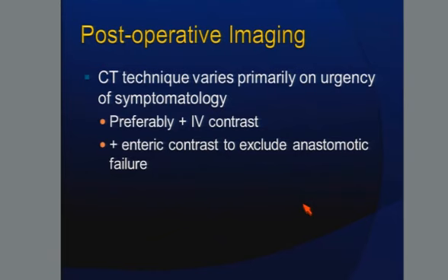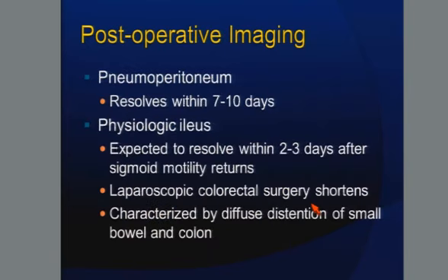Invariably, 2 to 3 patients a night come down with no oral, no IV, and those are complex cases that always happen after midnight. And then we do like to give an enteric contrast to look for an anastomotic leak. You are going to see pneumoperitoneum. Many of these patients now have their surgical resections laparoscopically, so they will have a little less air than the other patients, but you should be looking for air to resolve between 7 to 10 days post-op.